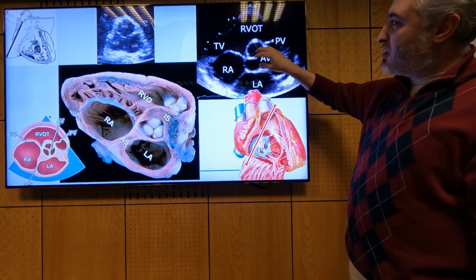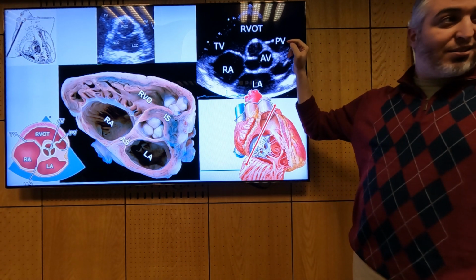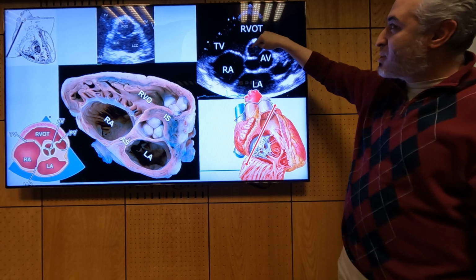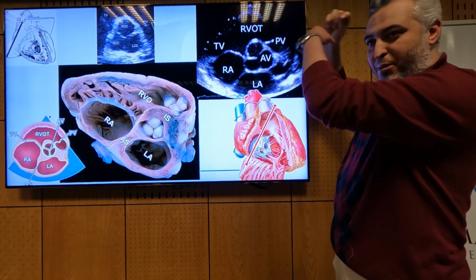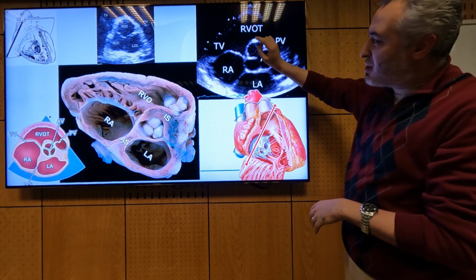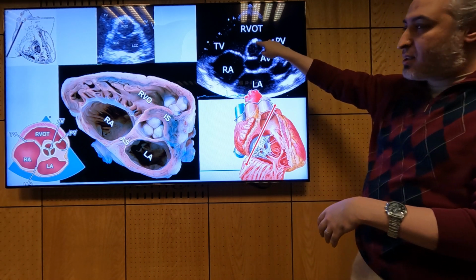The cusp that is toward the front of the patient is the right coronary, and the third one is the left. Because if you look from transthoracic, you look from the front, and then the right coronary cusp will be towards the probe. While if you look from the transesophageal echo, you look from the back, and then the anterior cusp would be away from the probe. So the cusp towards the atrial septum is the non. The one in the front, towards the front of the patient is the right, and the third one is the left.